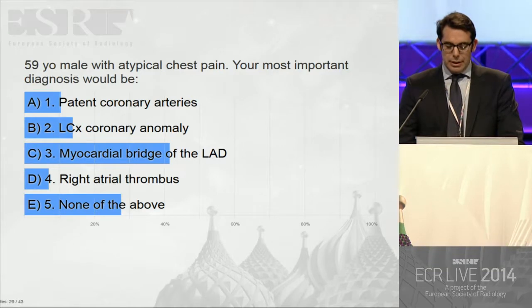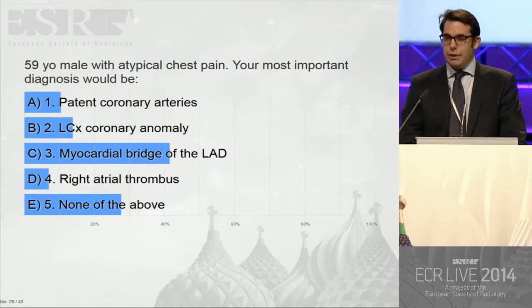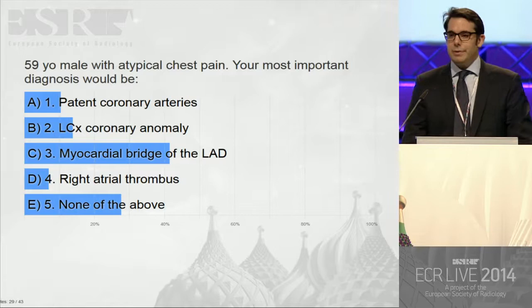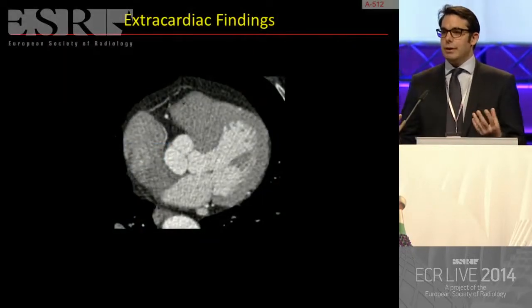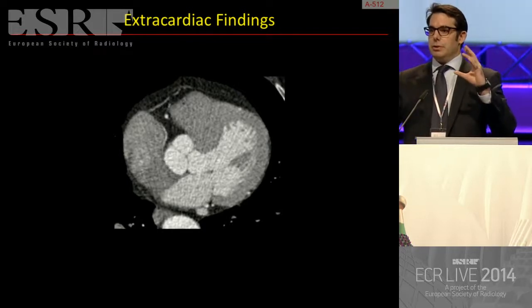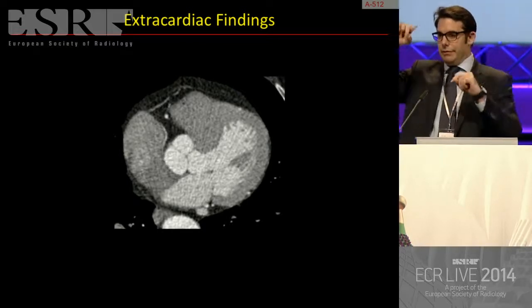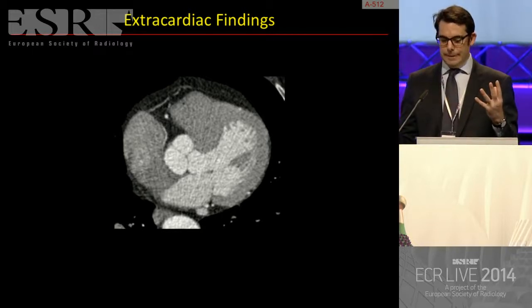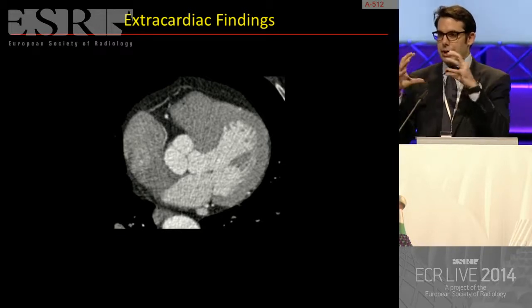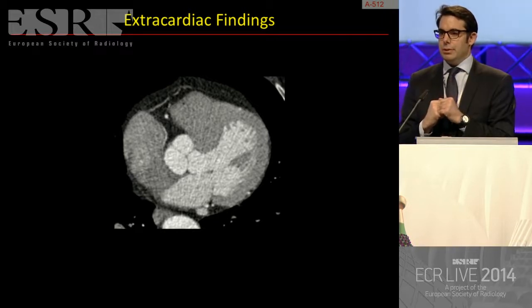So this is something that happens frequently. I would say none of the above, and I will tell you why. You know that we don't have good spatial resolution. We try to improve it. For that, we use a small field of view, so all the pixels of the 512 by 512 matrix have the most important information. So yes, this is what we do. We try to tighten the image. What happens, though? We can miss something important.